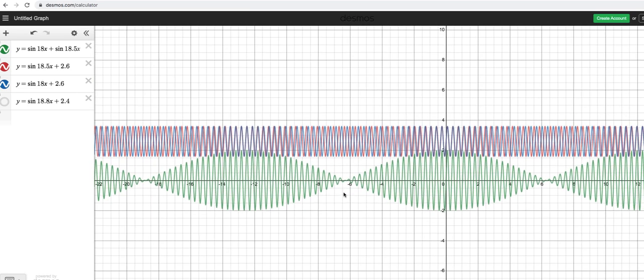So when we are looking at an alpha rhythm of, let's say, 9 hertz, it's possible that some frequencies are 9 hertz, others might be 8.5, or some are 9, others are 9.5. When those frequencies combine, this is where you start seeing the spindles. And this is a very nice illustration of constructive interference where the amplitudes are the highest, and destructive interference where the amplitudes are the lowest.